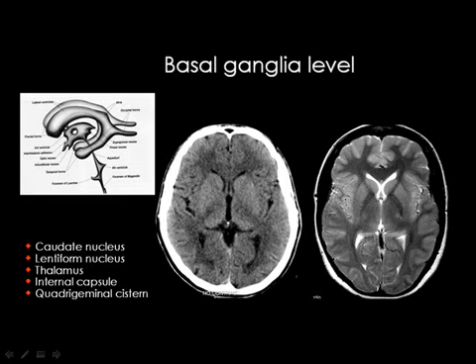Okay. Then after you are going up, you will cut in the lateral ventricles, and you are going like this upward. Then you have a section which is like this one. And here you are cutting in the lateral ventricle. This is the frontal horn, and this is the third ventricle, and this is the occipital horn. Then look at the CT section. This is the frontal horn, and this is the occipital horn, and this is the third ventricle.